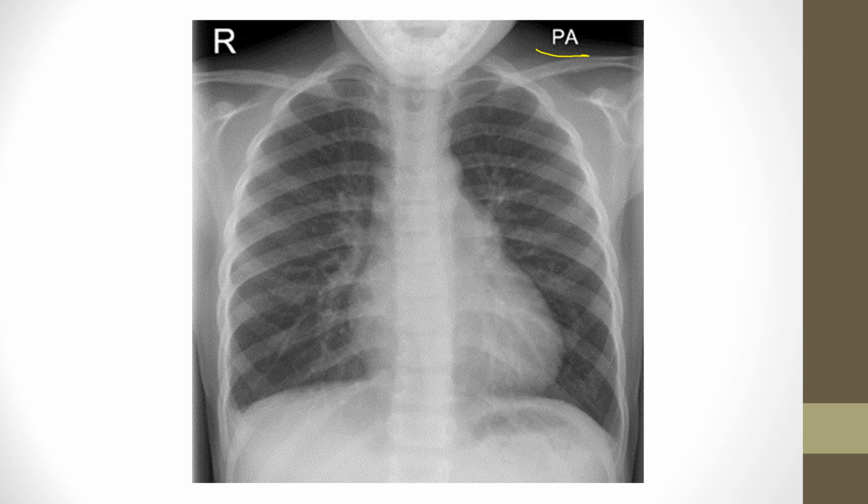Also, when you're practicing, this is good for testing too. Make sure you're looking for things like the penetration of the film, right? Can you see the vertebral bodies through the cardiac silhouette? If I could draw straight lines, that would help me. Should have passed that first grade. Also, look for symmetry, right? Do I see the tracheal shadow? Here's my carina. Am I identifying my landmarks? So things like that. Start going through there. Start making sure you're identifying things and using your technique. The more you practice it now, the better you'll be when you're out.